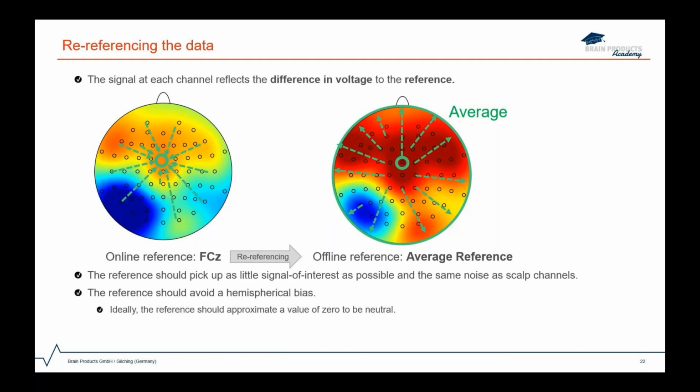And importantly for this average reference is that it works better with higher electrode counts and larger scalp coverage. So here we have, for example, with our recording 64, which makes it safe to use this referencing scheme. But there are other referencing schemes, as for example, the average mastoids or the earlobes, where instead of averaging all the electrodes, we will generate an average of electrodes located at the mastoid area or placed over the earlobes, and then do the referencing of each electrode to that average.